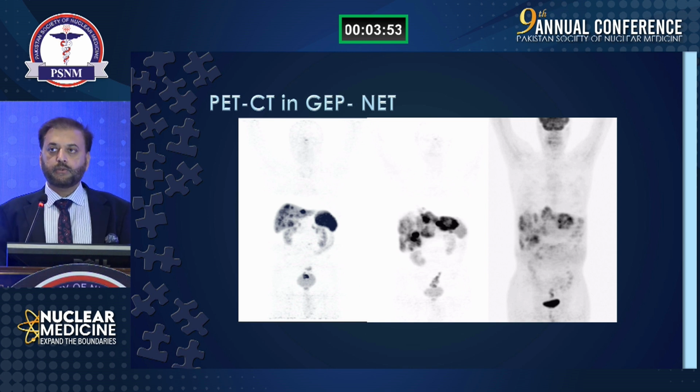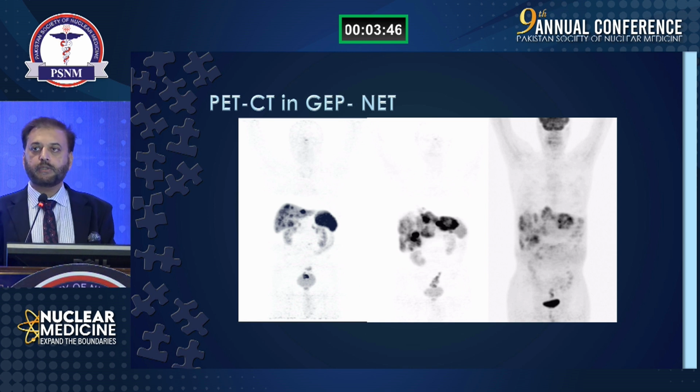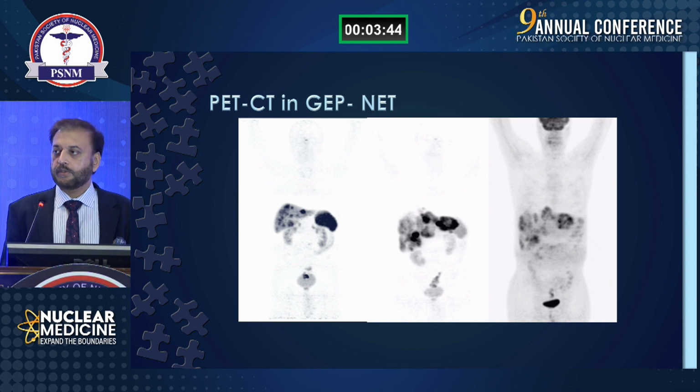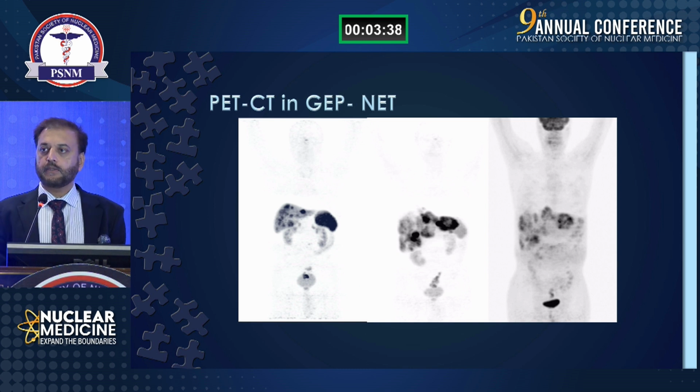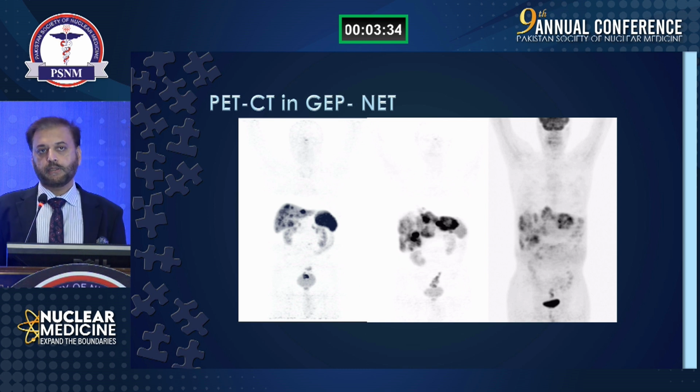This is a case of gastroenteropancreatic neuroendocrine tumor, and here we can use DOTA-TATE PET scan, which has been recommended by many clinical guidelines now. Just on your right side is the FDG PET scan in the same patient who has shown progression on 2 consecutive DOTA-TATE PET scans.